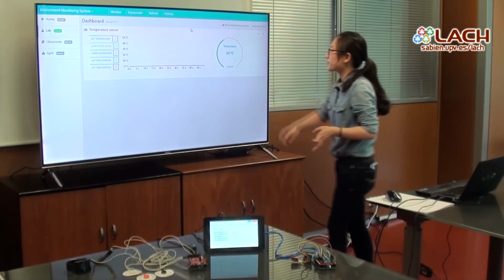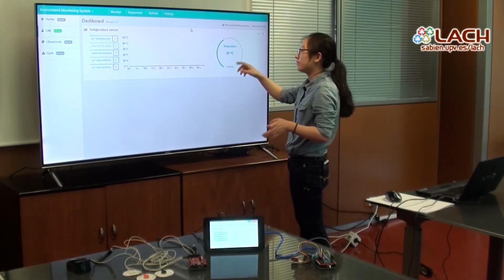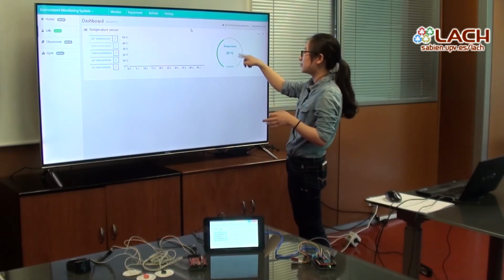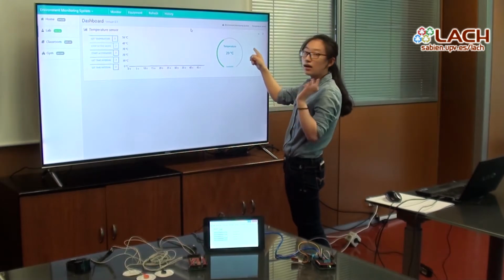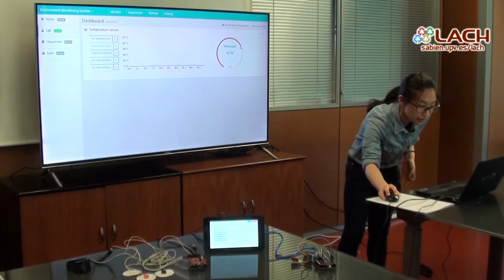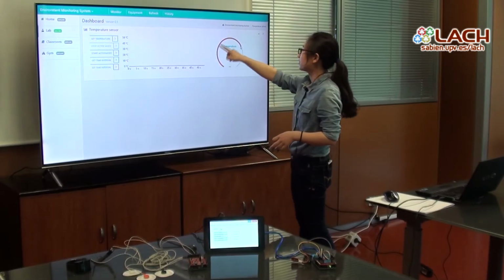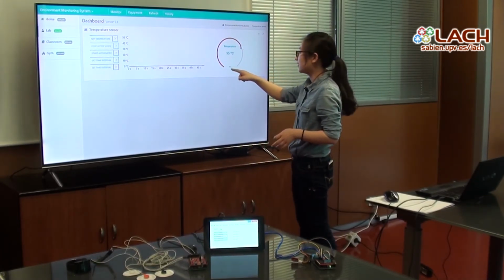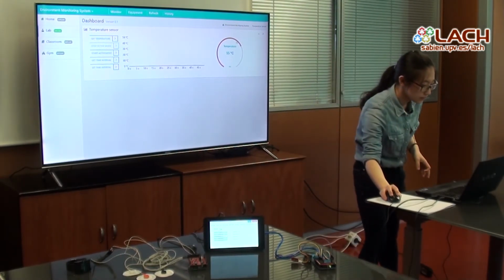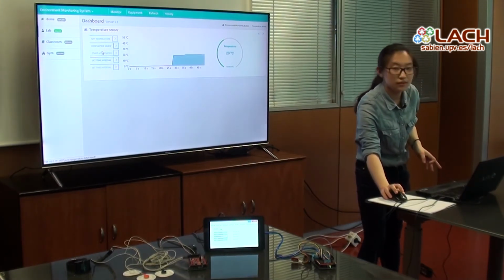And we can see the color of the knob corresponds with the temperature. If the temperature is low, the color will be green and blue. But if the temperature is high, it will be orange or red. So let's try. If the temperature is about 35 degrees, it becomes a red color, and the notification will be hot. And if we start the active mode, it will be shown like this.